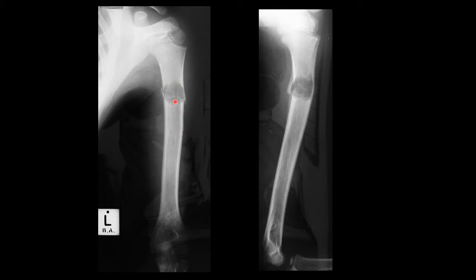E for extent, you can see it extends through the cortex on the lateral aspect and the medial aspect. You can see here this thick sclerotic line as opposed to the medulla, and the thick sclerotic line representing the cortices. This is a tube of hard outer bone and medullary bone inside. And you can see this is attenuated here. So in a three-dimensional way, you can see outside, inside, anterior, posterior.